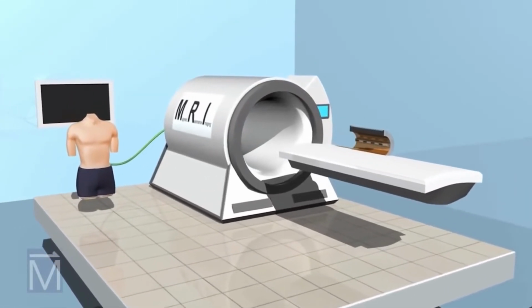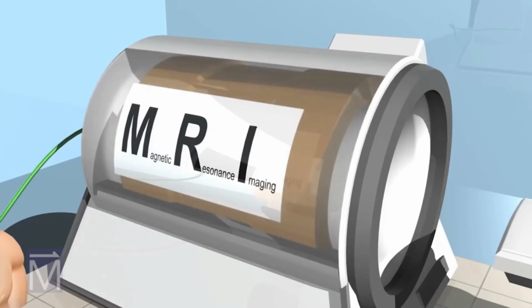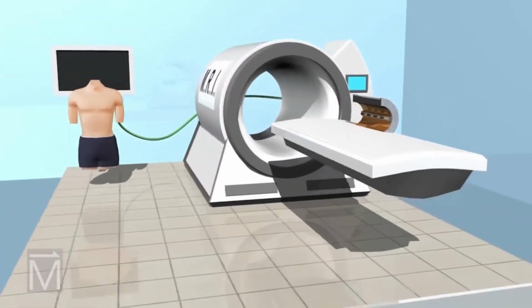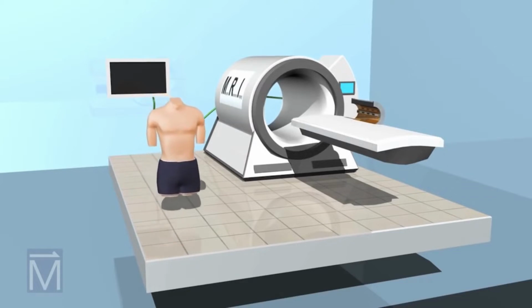Magnetic resonance imaging, or MRI machines, are powerful diagnostic tools that use strong superconducting magnets and radio waves to generate images of the body's soft tissues. Here we'll see exactly how the magnet's field interacts with the body to make those images.